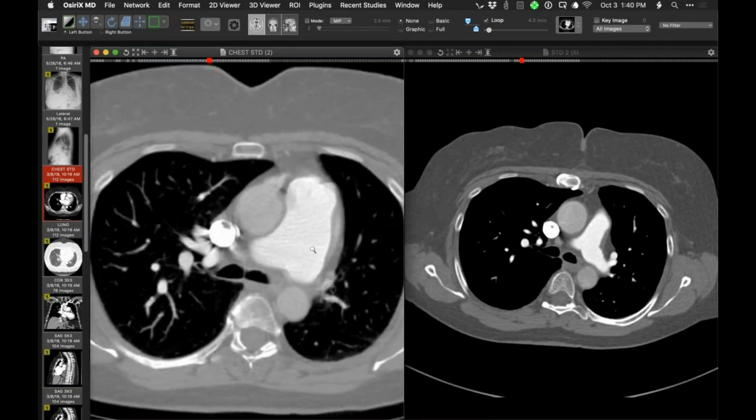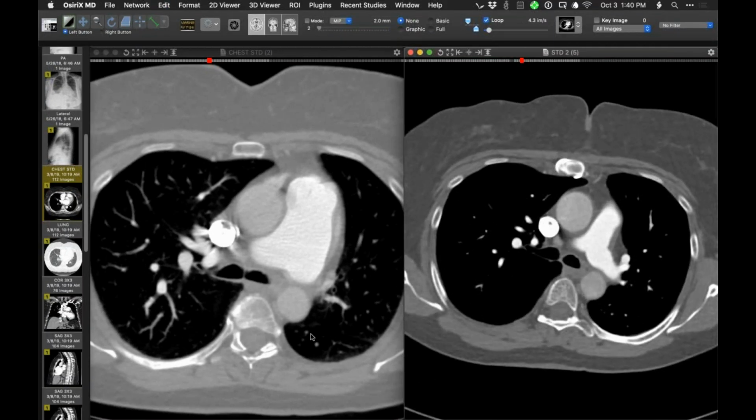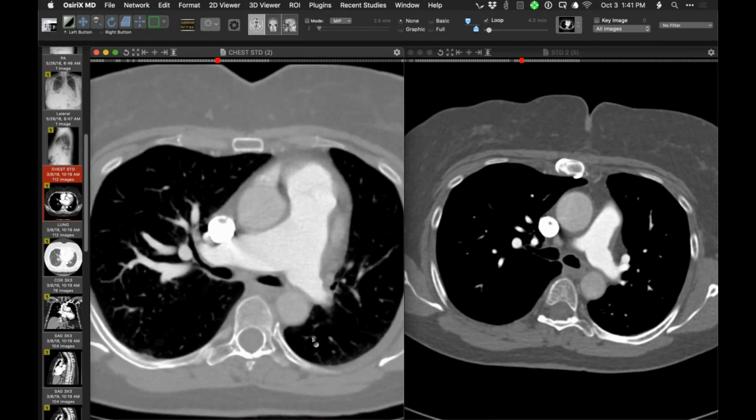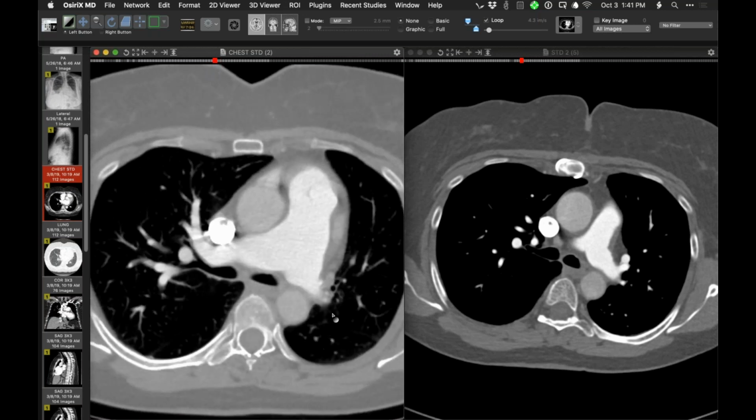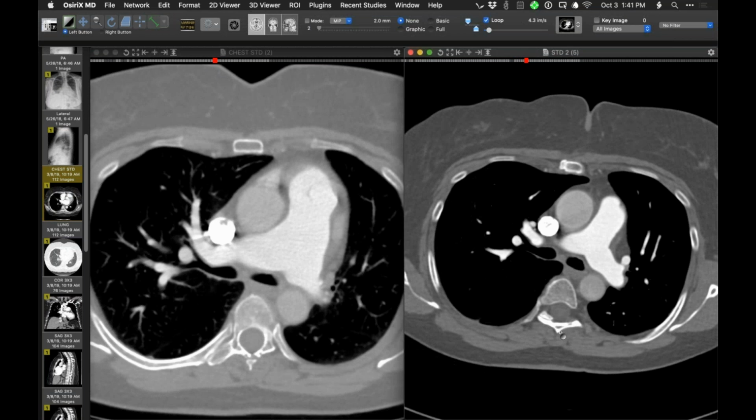So again, just to mag that up, that's actually a nice finding too. Mm-hmm. So before and after. So before, there's really just a nubbin here, nothing more than that. Yeah. Just a hint of a vessel there. Right. It opens up really nicely after the surgery. Her pulmonary artery caliber is decreased quite a bit. Yeah, and the main pulmonary artery caliber is also diminished. Yeah, so that's a very nice result. Absolutely. Yeah.